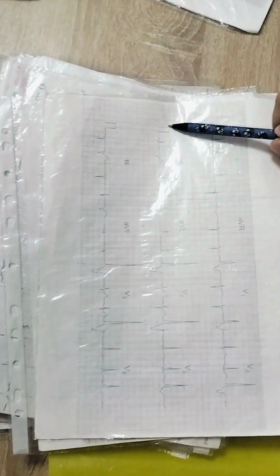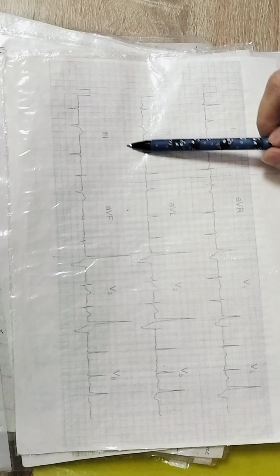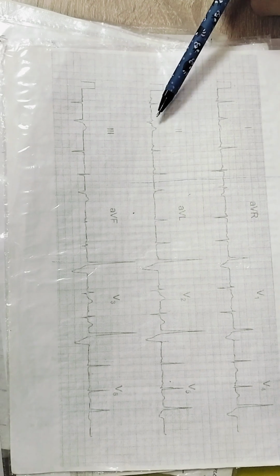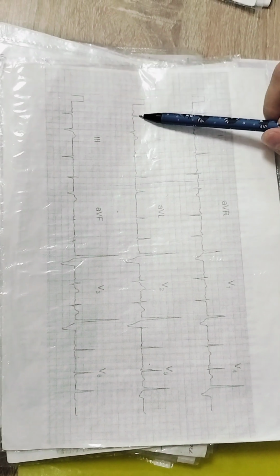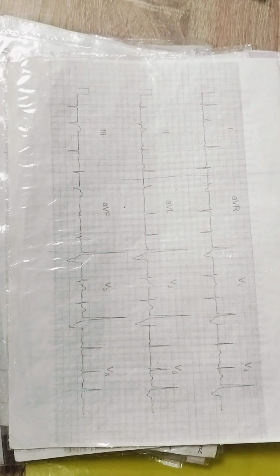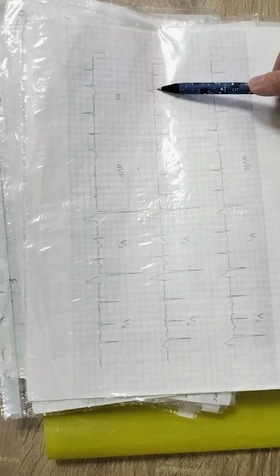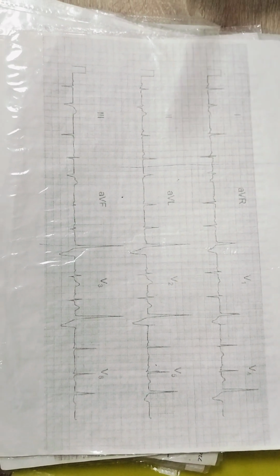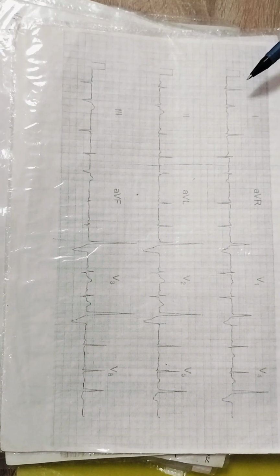In this case, quality: P wave is present, absent, present, present. So something wrong in this place. Everywhere P wave is present, written as sinus, but except this place. Next, this distance, this one and this one, they are not equal. There is arrhythmia. Arrhythmia in this place again. This distance is shorter than this one and this one. Next, to count heart rate, we need to count average numbers and use the formula.